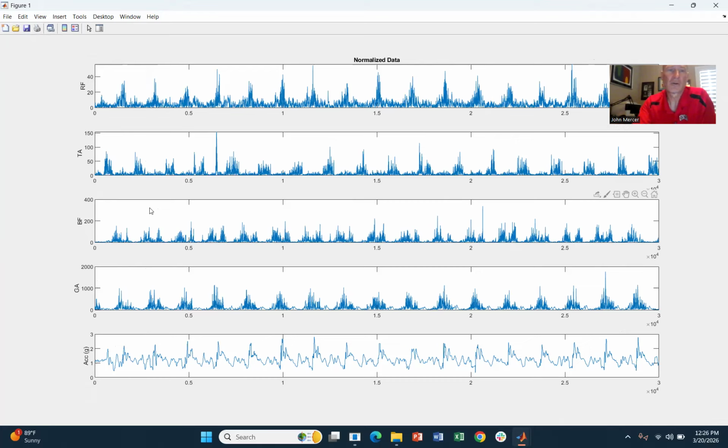And then the other thing I look for is potential characteristics of noise. So you see this spike right here. That's probably a movement artifact of the sensor, because it's uncharacteristic. It just sort of comes out of nowhere. Here you see a burst, burst, burst, burst, burst, and then this one happens somewhere between the regular bursts. So some type of noise entered the signal. So we got to deal with that when we're processing the data.